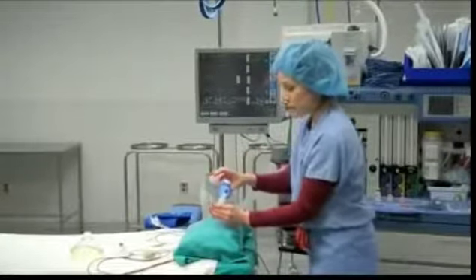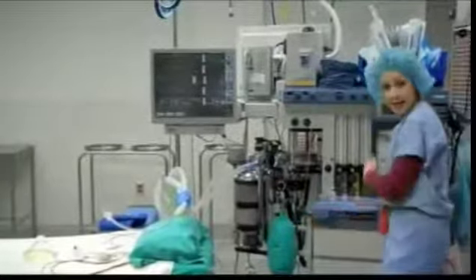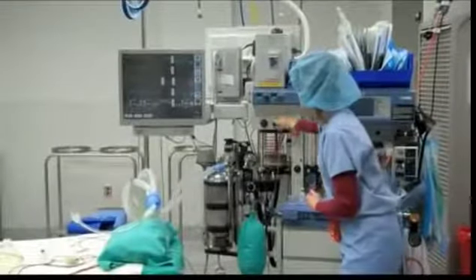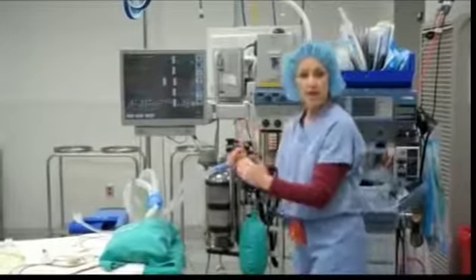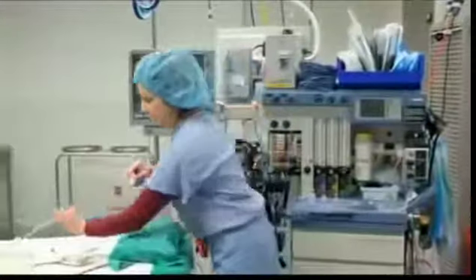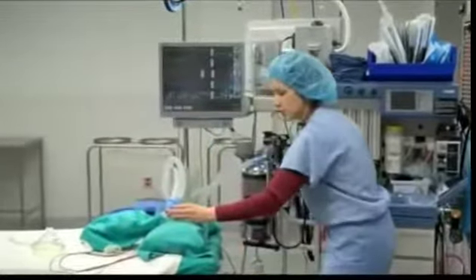So, what we do is once the breathing tube is inserted into the mouth, we then place the patient on anesthetic gas and then place them on our ventilator. Because what we've done is we've relaxed the patient and we've taken away their ability to breathe. And so now we need to take over the breathing for them. So for the purposes of this demonstration, I'm going to simulate a patient's lung. So this green bag right here represents a patient's lung.